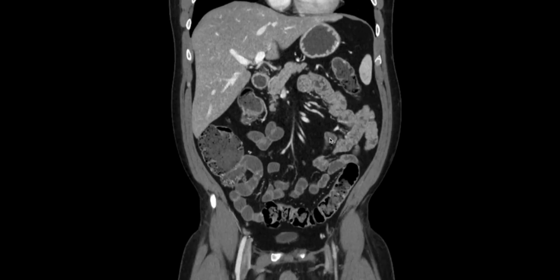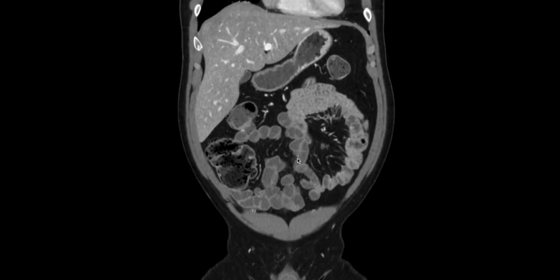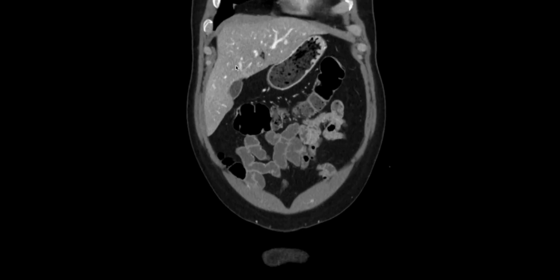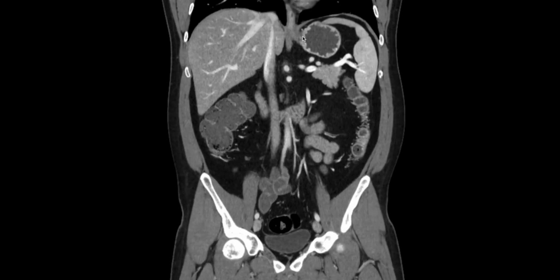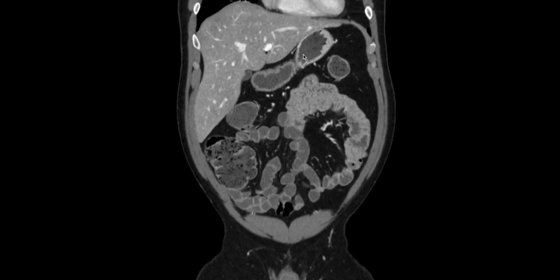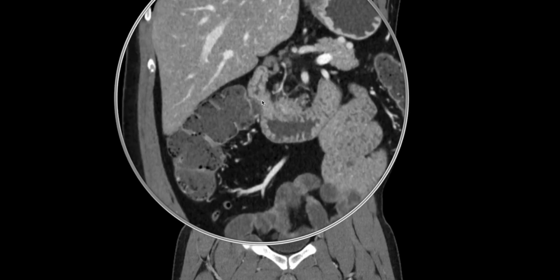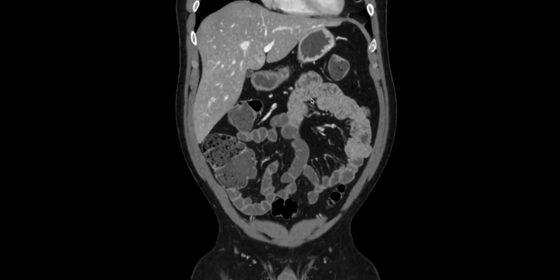And when we're evaluating the gastrointestinal tract, what you'll notice is we get to see much longer segments with larger clusters of the small bowel. Here we can appreciate the difference of the feathery fold pattern between the jejunum and the ileum, as well as the characteristic pattern of haustra within the large bowel. Running that upper gastrointestinal tract, here's the distal esophagus, gastroesophageal junction, gastric body, antrum, and then that sweep. Second portion of the duodenum down, third portion crossing midline, ligament of Treitz, into the proximal jejunum.